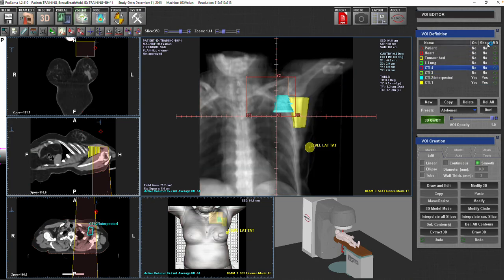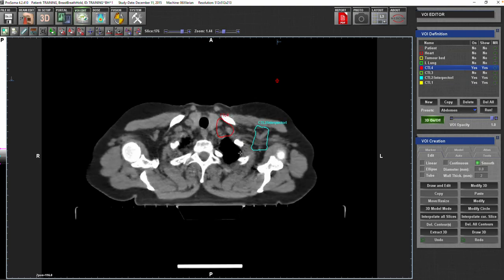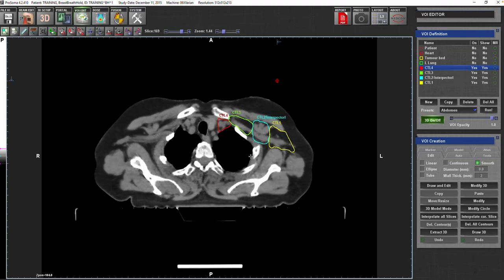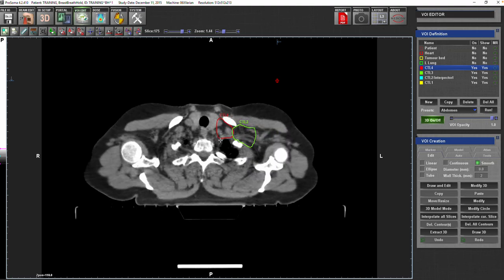And you will also be surprised that after drawing all this, when you look at it and get your table for the target volume delineation, you'll start to familiarize yourself more and more, and you'll start to see, oh, I need to push this a bit more. For example, here you shouldn't leave a space there, I should be medial to the vessels, I shouldn't take extra space, and so on.